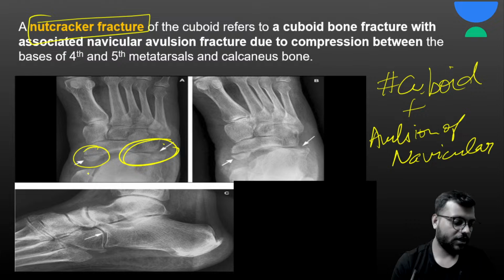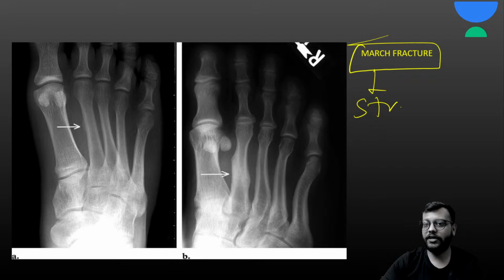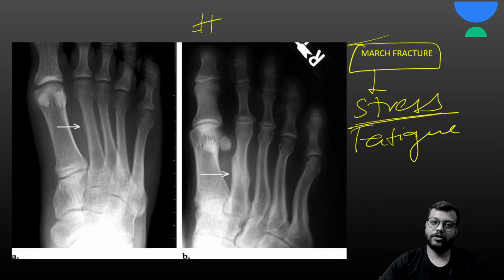Okay, now this is your march fracture, which is very important and very easy. Everyone must know this. This is your stress or fatigue fracture and generally it is a fracture of the shaft of the second or third metatarsal.